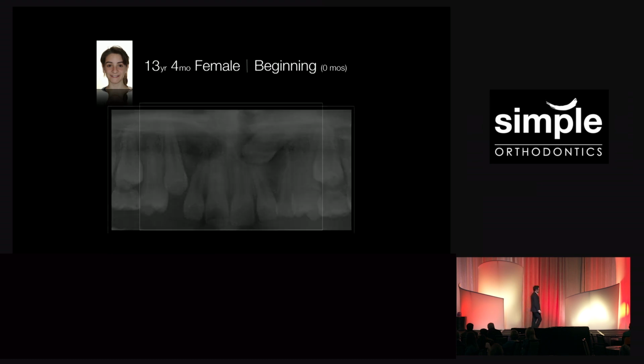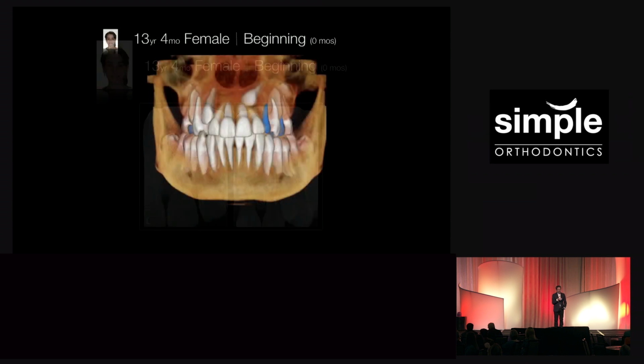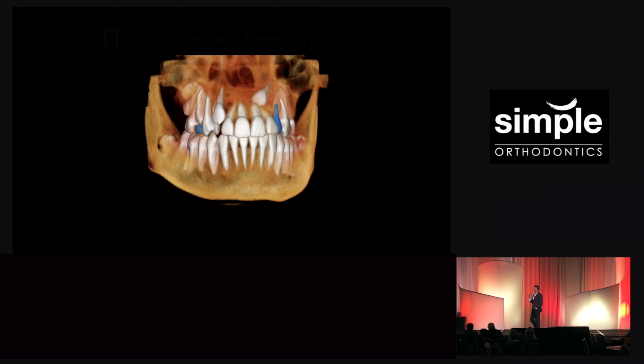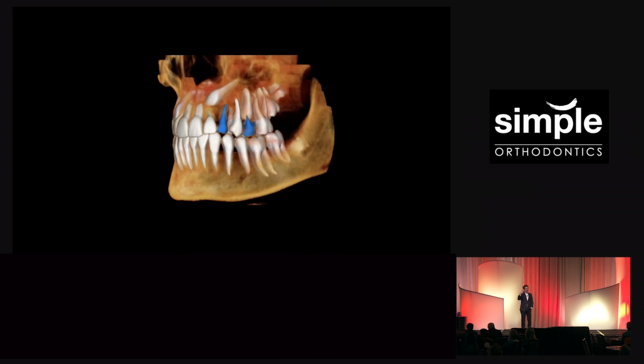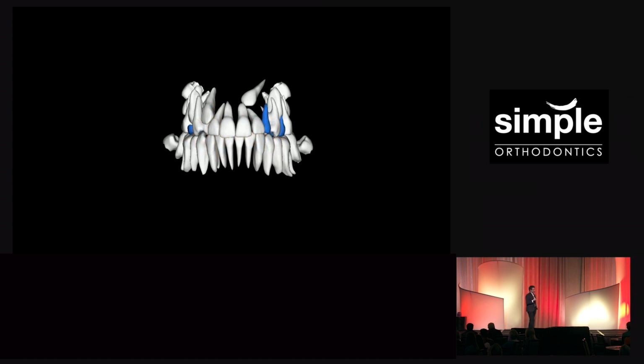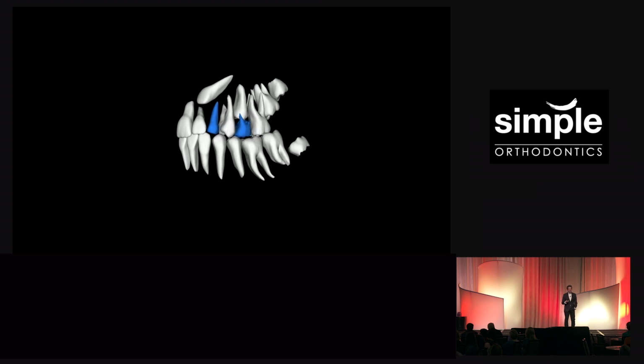I'll give you some PAs because the dentist took those. Is it lingual or buccal? Which way would you advise your surgeon to go in? And more importantly, which way would you pull? This is why I got into cone beam. And I think Jessie was actually just before I bought my iCat. I had her go get a new tomo at a lab so that I could do this. And now I can see exactly where that tooth is and what I have to do to pull it in.